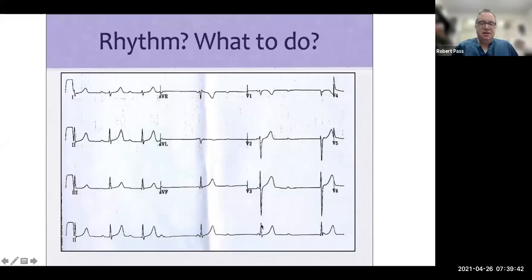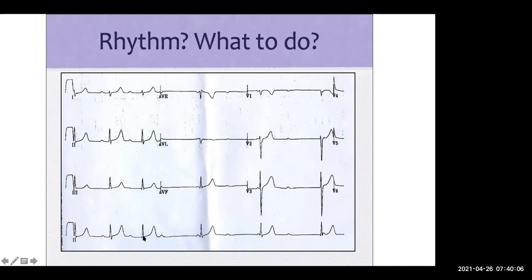Well, the thing is, of course, it's a hard tracing to interpret because there are no lines on the EKG, but the atrial rate in this tracing, let's say for the sake of discussion, is say 60 beats per minute, okay? This P wave is very short, so I think this is Mobitz 1, clearly, right? The PR interval is lengthening, and then there's a P wave that's dropped.